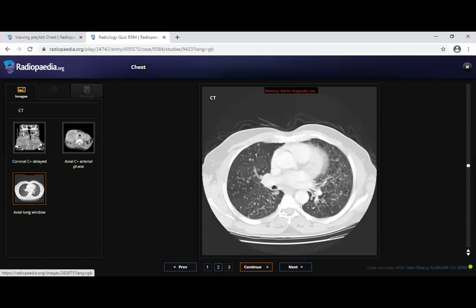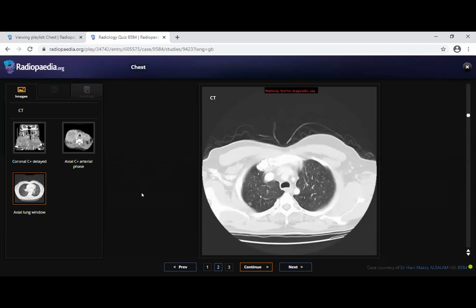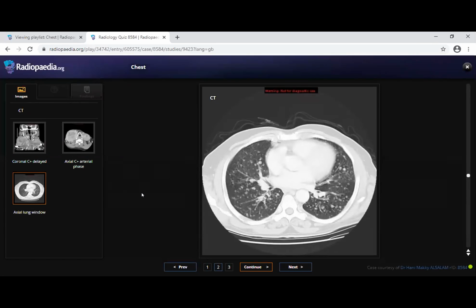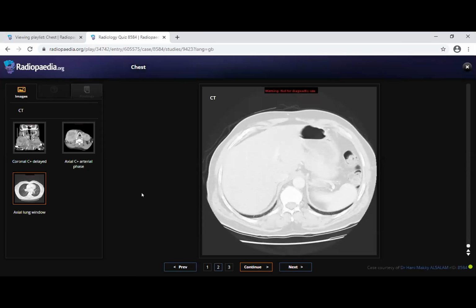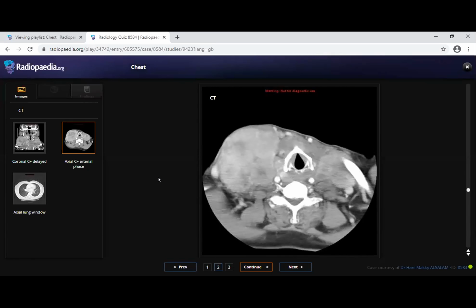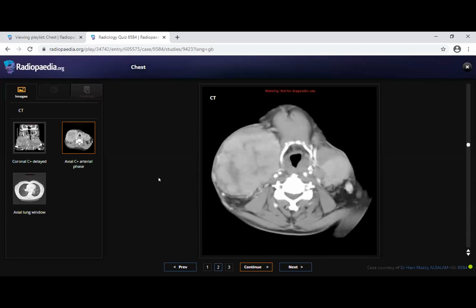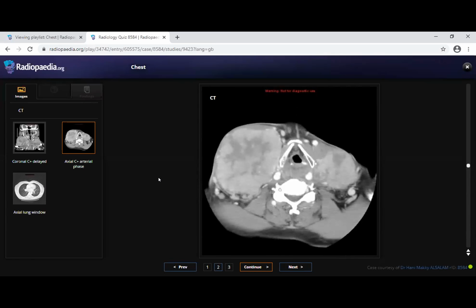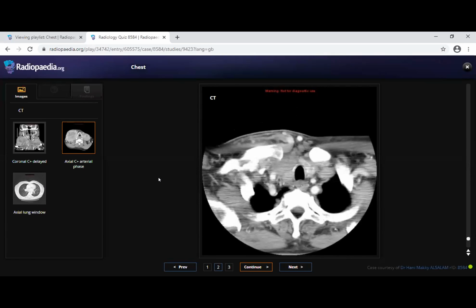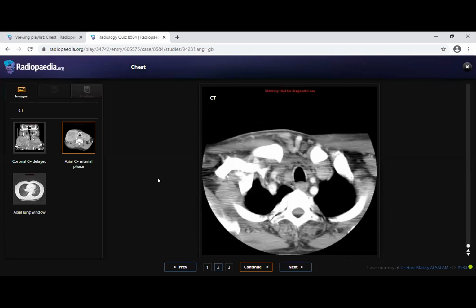In the X-ray, I suspect there is supraclavicular soft tissue shadowing. In CT, I see a bilateral supraclavicular soft tissue mass lesion, which could represent the thyroid versus lymphadenopathy. Yes, there's a right thyroid lobe soft tissue mass with a necrotic lymph node on the other side, with multiple pulmonary nodules. In summary, there is a neoplastic process involving the thyroid, malignancy with pulmonary metastasis. I'd like to refer the patient to the referring physician and discuss the case with the MDT.